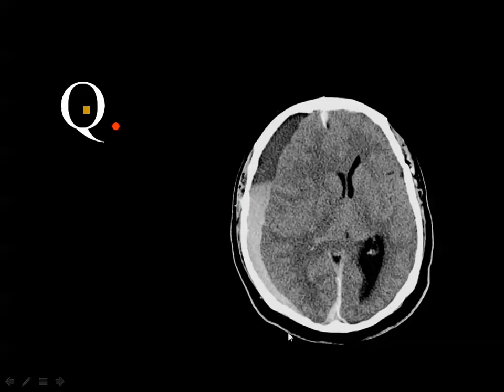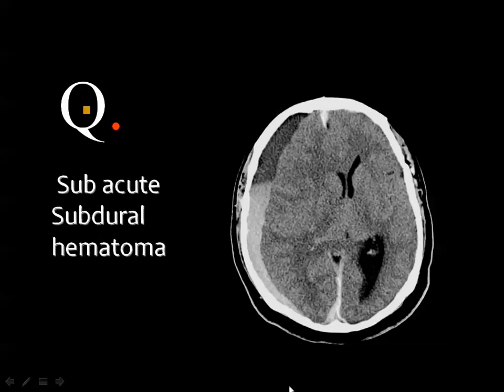Axial CT scan of the brain without contrast showing an extraaxial subdural collection of mixed hypo and hyperdensity covering the surface of the right cerebral hemisphere, extending into the falx posteriorly and anteriorly. Diagnostic of subacute subdural hematoma.